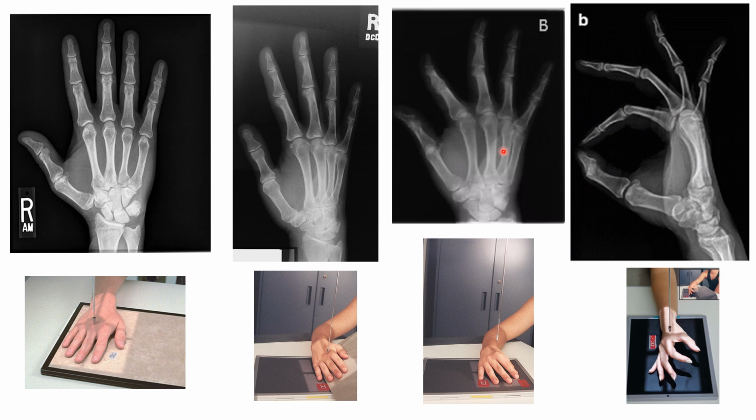Once again, some of these things may be due to patient condition. Patient condition definitely plays a huge role in diagnostic quality of our images and how we see the anatomy in images. So, not being the technologist that did that X-ray or being there at the time, I can't really say, oh, this is a bad X-ray with insufficient rotation, because I wasn't there and I don't know the condition of the patient at that time.